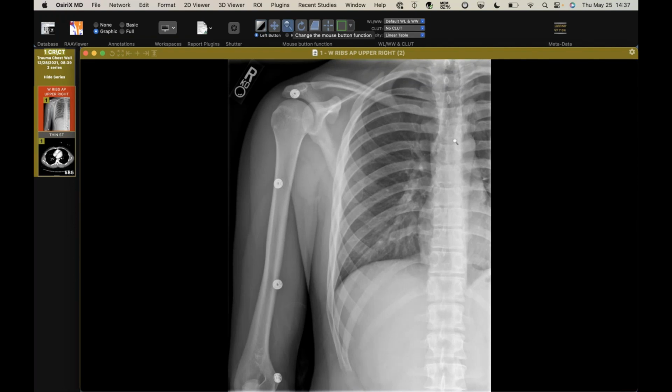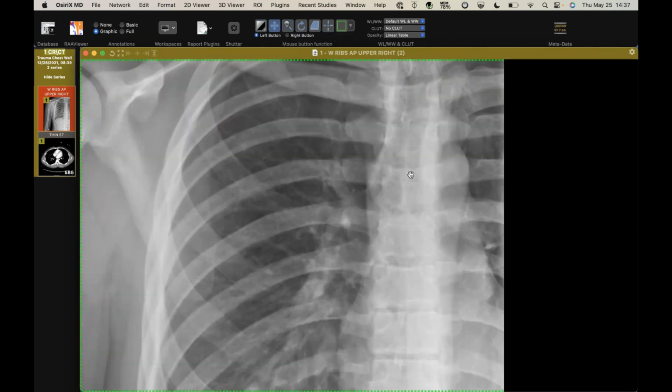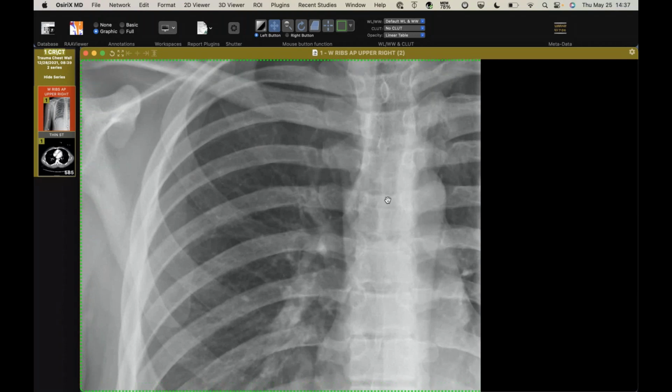It's really hard to see, but I did find this contemporaneous. I don't know why at the outside hospital, his trauma must not have been so bad because they did a rib series rather than the usual trauma workup. All you can really see is a subtle difference because it's pretty well centered in the alignment of the clavicular heads. But I'll have to be honest, I think that's a really hard call to make even on a good day.